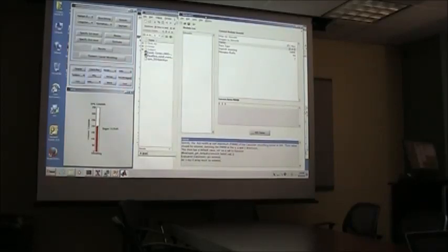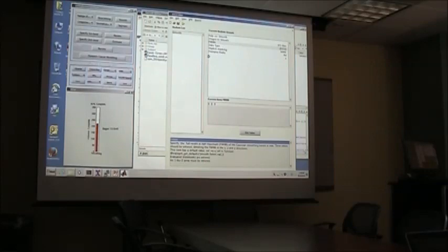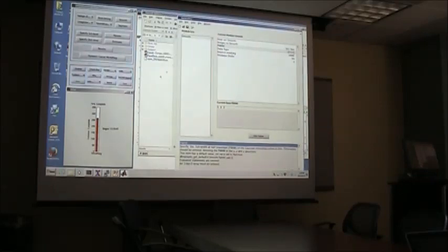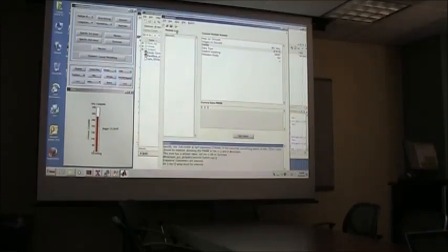But I guess the thing is, in this example I've loaded up a previous batch, but basically when you work with the data, you can load this up and run it in SPM. Another thing, which would always be good, is to save this file. And if I want to wait until this is done before opening it up in different ways, you can just save this file, which you can then open in basically three ways.